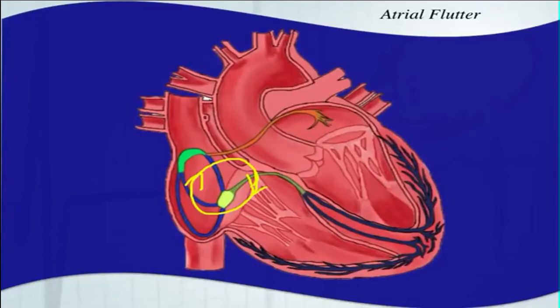It usually occurs about 250 to 300 times per minute. That's pretty dang fast. So those atria are depolarizing really fast, about 250 to 300 times per minute. Way too fast to sustain life. Now every so often, the ventricles will take that depolarization and continue it down into the ventricles. Hopefully not 300 times per minute, because that is way too fast to live.